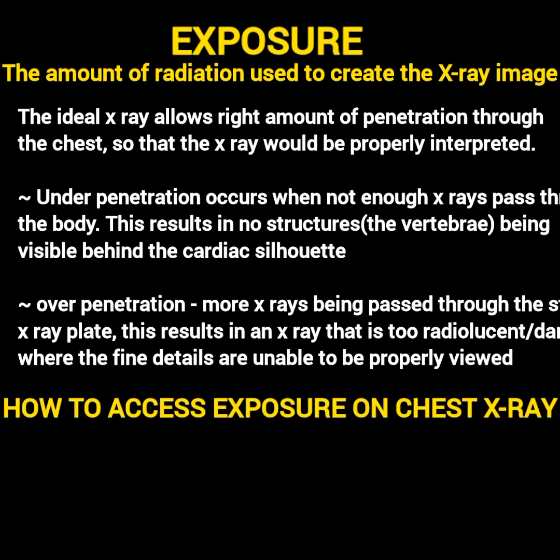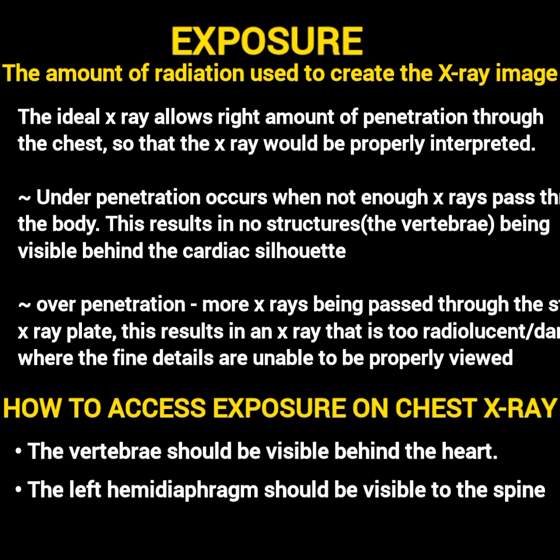How to assess exposure on chest X-rays? The vertebrae should be visible behind the heart, and also the left hemidiaphragm should be visible to the spine. This shows there is good exposure.